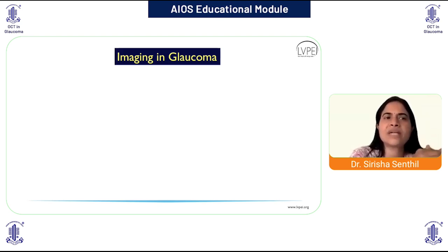We need to understand that there are non-glaucomatous conditions like neuro-ophthalmic causes, like the nutritional optic neuropathy example that we saw, as well as the hypoxic ischemic encephalopathy example, where the disc, field and OCT may correlate, but not necessarily does it relate to glaucoma. There can be other conditions that need to be diagnosed.